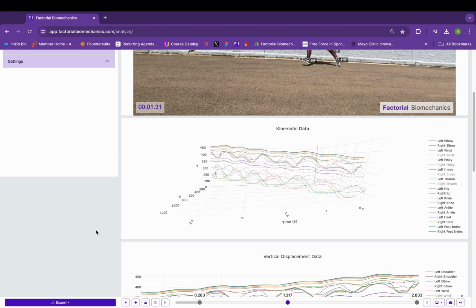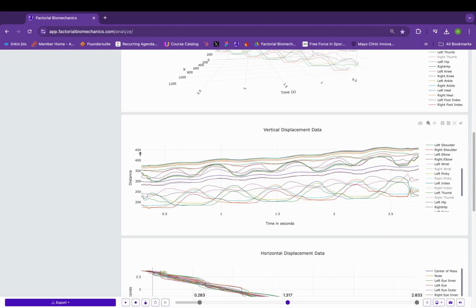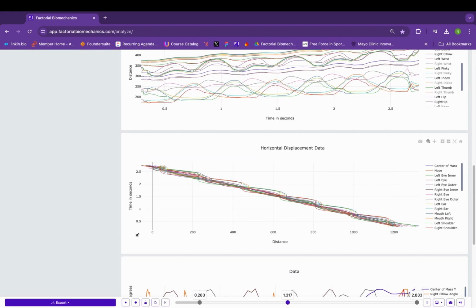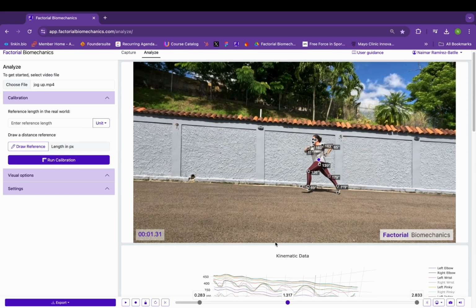We recently had questions about the axis numbers, for example. Here, these are pixels until you calibrate. 0 is at the bottom left corner of the frame. To calibrate in this video, I'm going to pick a moment where I'm almost straight.